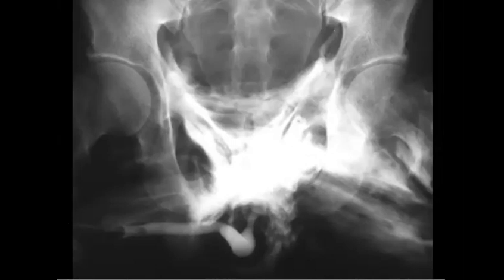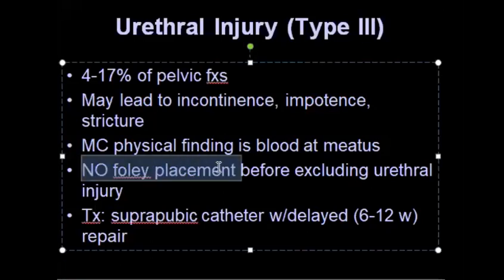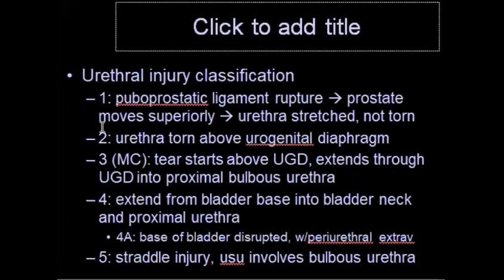So nice. Let's check it. So this is what's called urethral injury. The most important thing to know is no Foley placement before excluding urethral injury. Okay. And the classification of urethral injury. Okay.